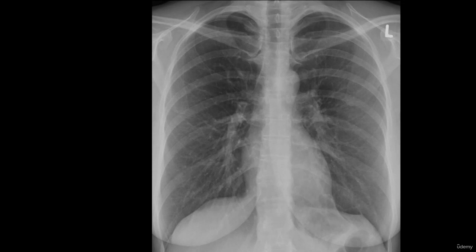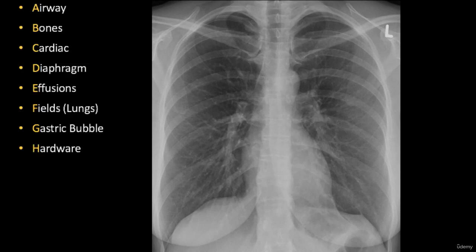The evaluation of the thorax traditionally begins from the X-ray. It allows us to see how symmetrical the structures are and gives us some clues about what we should point our attention at in the future. To read the X-ray of the thorax, we need to know what a normal X-ray of the thorax looks like, right? It's always easier when you have a plan in front of your eyes. And this algorithm that is usually followed by a radiologist is here on your screen.